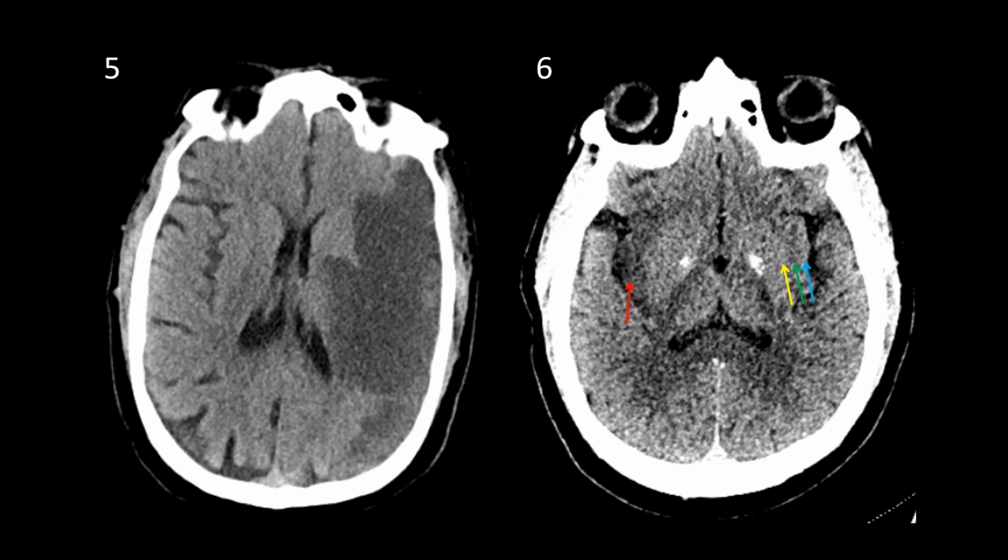Around 12 to 24 hours after onset of symptoms, as the infarct enters the acute phase, edema develops as damage to the surrounding brain tissue progresses. The infarct thus becomes visible on non-contrast CT as an area of hypoattenuation and loss of gray-white differentiation. The developing edema often results in mass effects, such as gyral enlargement and crowding of nearby cerebrospinal fluid spaces, such as the ventricles and sulci.